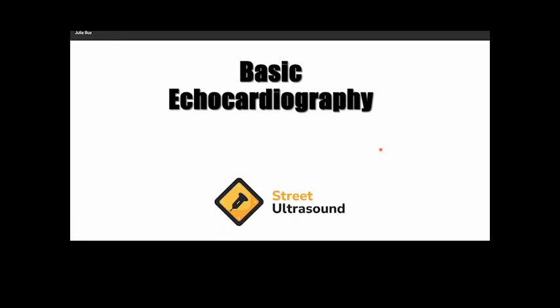All right, moving on to basic echocardiography. And notice the word basic. We're not doing anything fancy that the cardiologists are doing. We're looking for things that can help us change our management in the field, such as, do we even have a heartbeat, right? So our basic echocardiography is going to help us answer those questions.